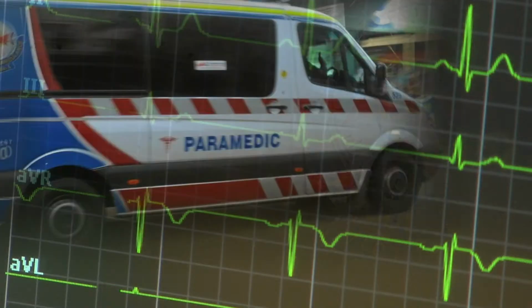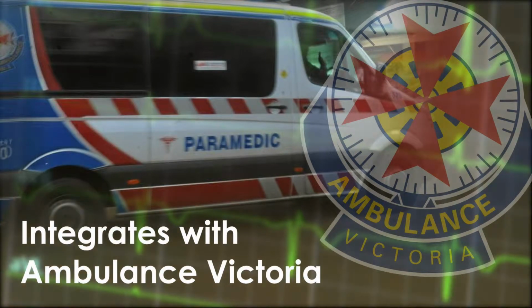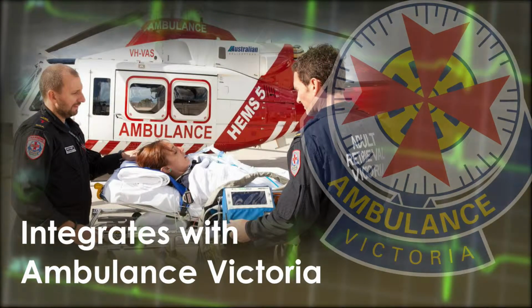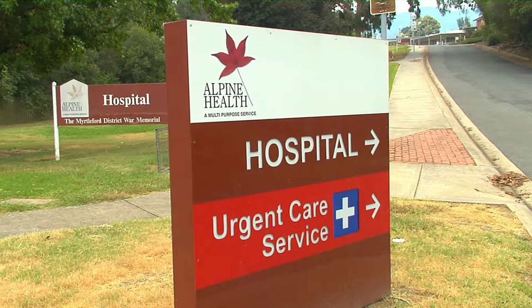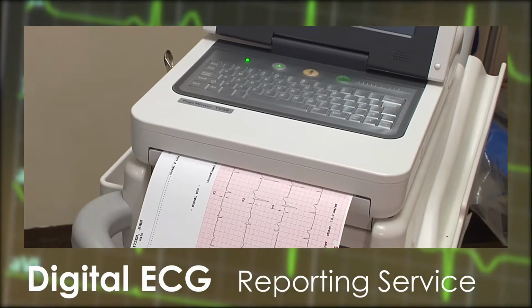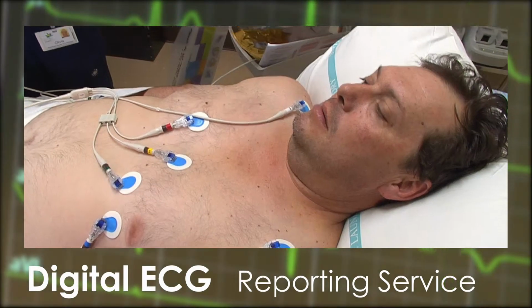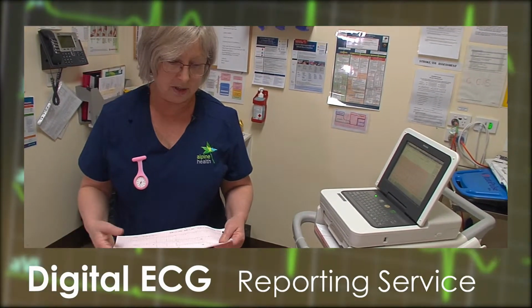Ambulance Victoria can also access these digital ECG images when a patient is transferred from a rural health service for cardiac intervention or to the closest regional health service for further management. Most patients presenting with chest pain will be managed locally by the GP and nursing staff. The digital ECG reporting service complements and is integrated into existing processes to support rural clinicians manage patients with chest pain and acute coronary syndromes.